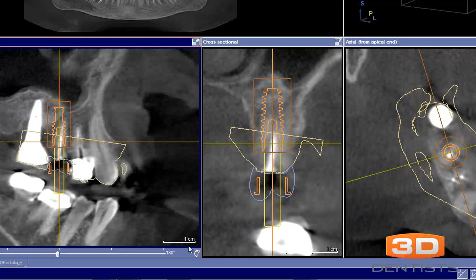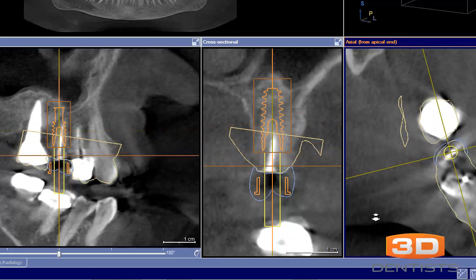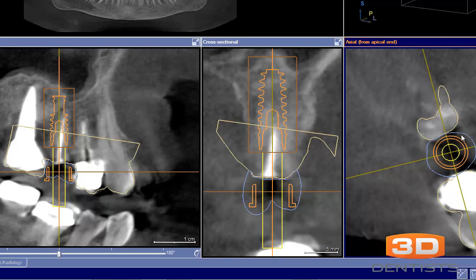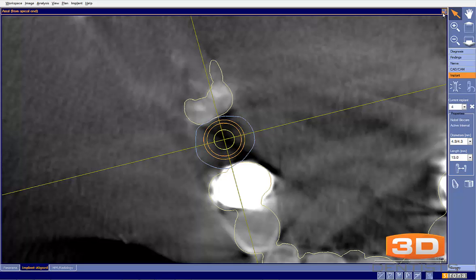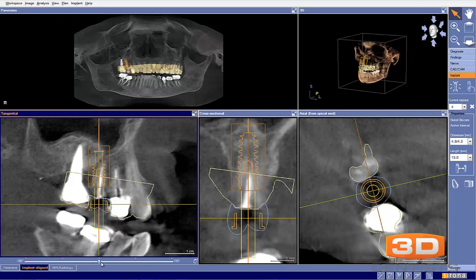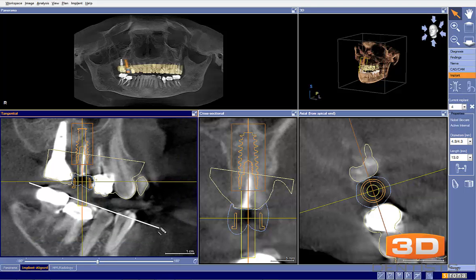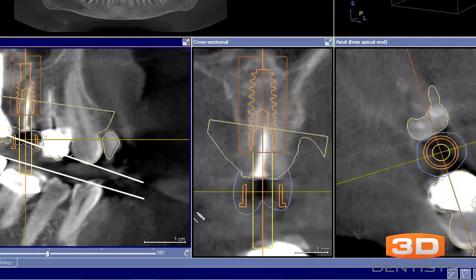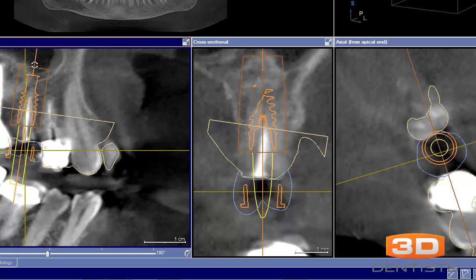The area that I have the most concern about in terms of this particular plan is going to be our occlusal plane and our occlusal table. In evaluating this, we can see our implant is well centered in the occlusal table here, looking at the axial view. Everything looks very nice there. But in looking at the occlusal plane, what we do see is that our teeth are pointed down like this. So our implant is going to receive forces not on the long axis. So this one would require us to tilt the implant.